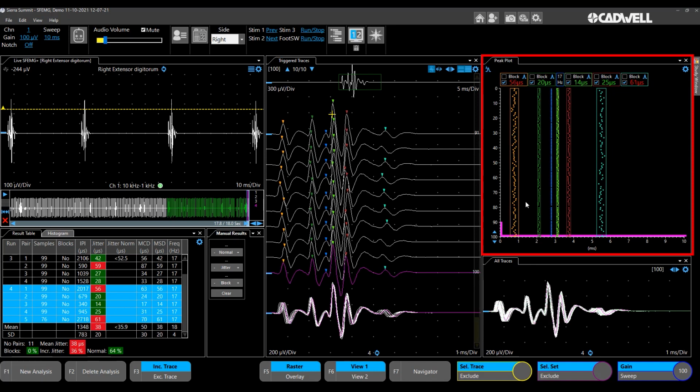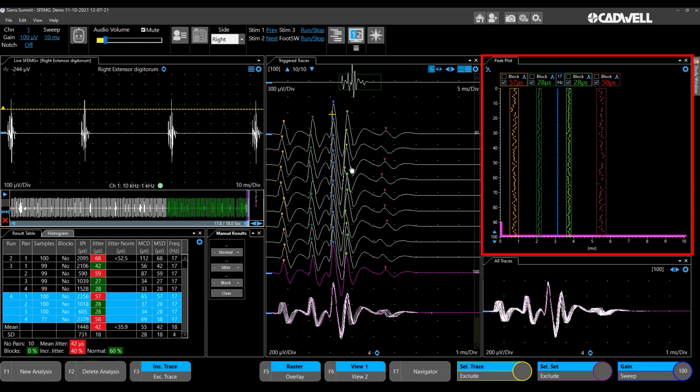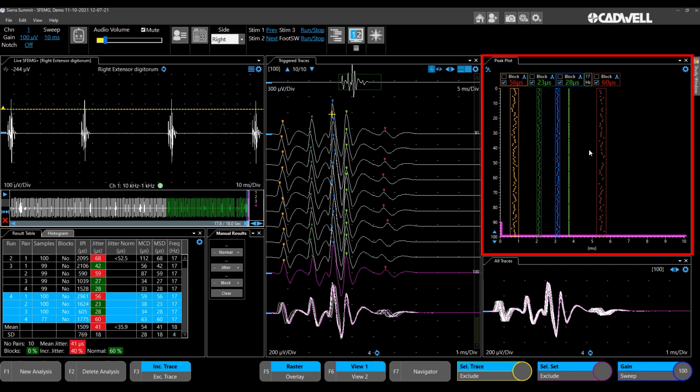The reason you may want to do that is maybe you want to exclude one of these peaks. Maybe we didn't like the blue peak, so we could choose a different peak and then exclude the blue peak from the data set. So we just come in here and uncheck this box in the blue peak, which gets rid of that peak, and now we can use auto reference, and it will find the best peak to use as a reference peak.